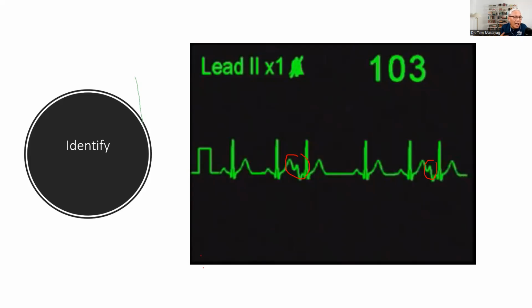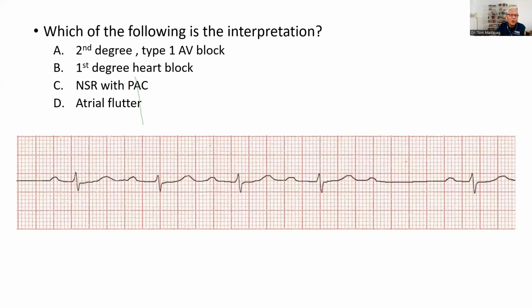So when you see a lot of PACs, make sure you auscultate the patient's lungs and try to determine if there are any other signs and symptoms that reflect the presence of congestive heart failure. Okay, great. Let's go to the last one right here before we go on to our quiz.